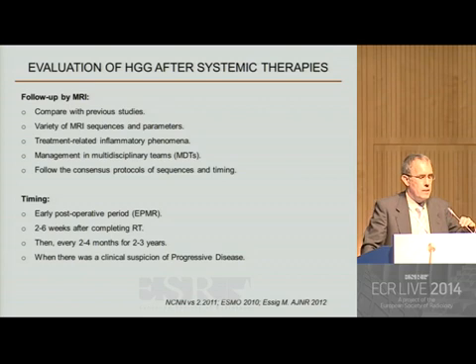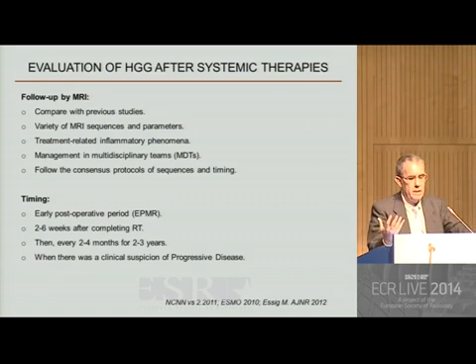With MRI, as you know, there is a large variety of sequences and parameters, and this can also be a problem for follow-up, because sometimes the current examination and the previous one are not very comparable, are somewhat different. This is also a difficulty. Additionally, we can find treatment-related inflammatory phenomena that can mimic or overlap the tumoral activity.